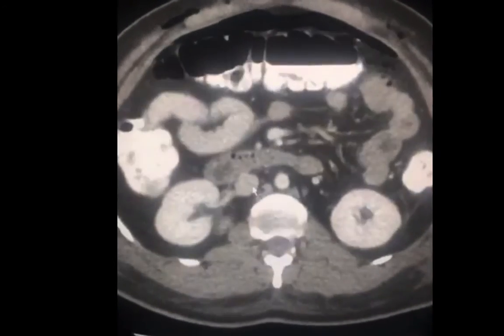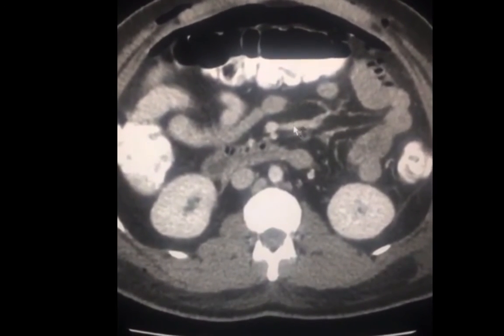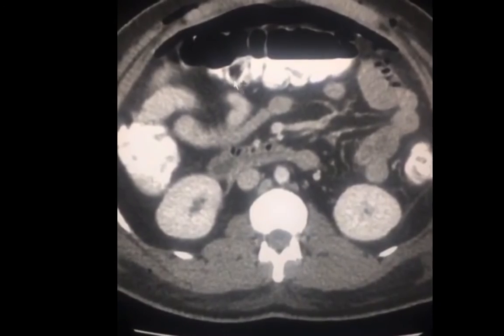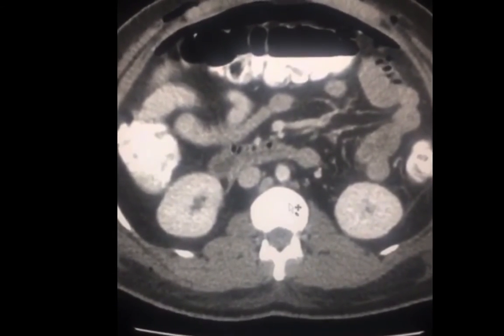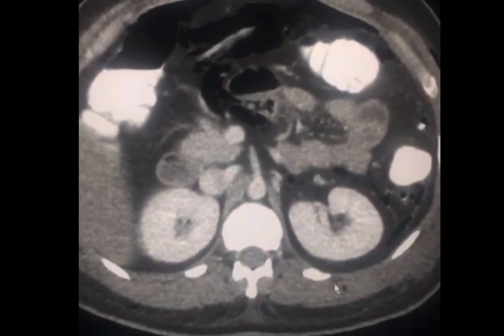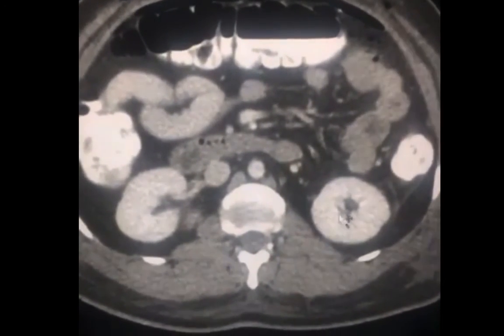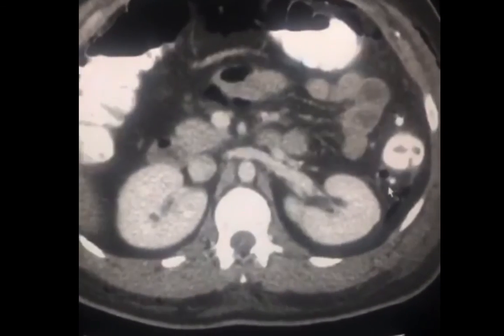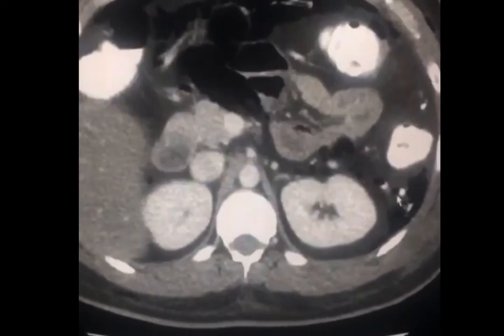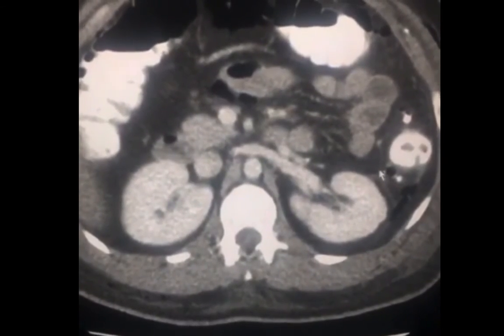The other learning point is to recognize the distribution of air or fluid within intraperitoneal or retroperitoneal spaces. Localizing free air or fluid to a retroperitoneal space is very useful. For example, in the current case, recognizing the distribution of air made us look carefully at retroperitoneal structures.